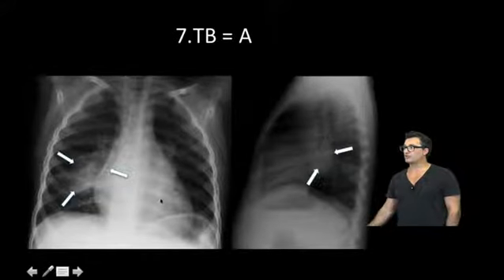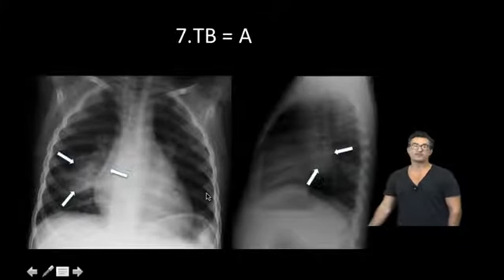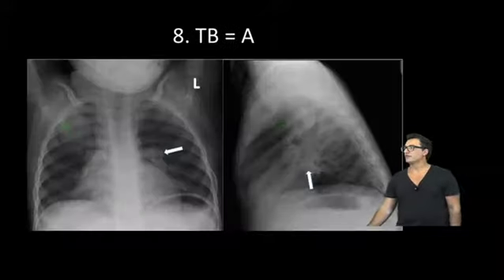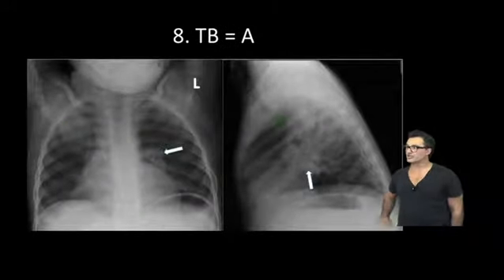I didn't put an arrow on it, but I don't see an open V of the vessels here. I suspect lymphadenopathy on the left also, but I have enough to call it just on the right-sided pathology. Right. 8 for me is tuberculosis diagnosis.